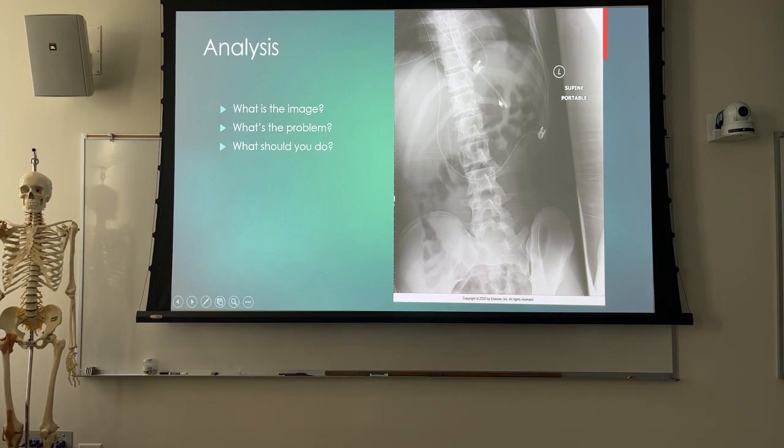Tip. That's a left tip, right? So did you go up to the room and shoot this for a feeding tube placement? If you did, this looks like it's probably a duodenal tube, like a Dobhoff or something like that. That's not where they want it. Where do they want it?